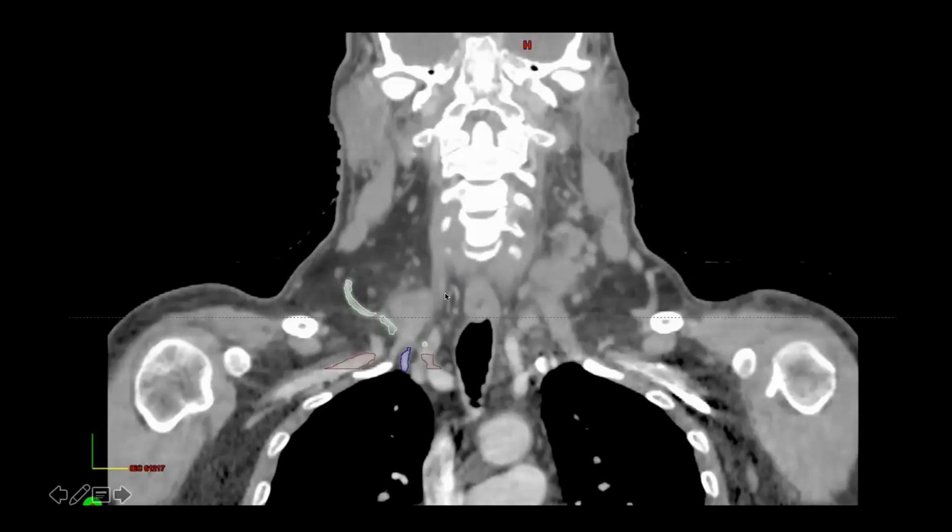So it's much more clearer on a coronal section. Over here you can see this is posterior to your sternocleidomastoid. This is your level 5 territory. Inside this, where the transverse cervical vessels enter, this is where you have to put your lower border to include your level 5B. So you have to include all this vessel inside, so probably a good way is to always delineate the transverse cervical vessel so that you don't miss it. I hope it's clear.